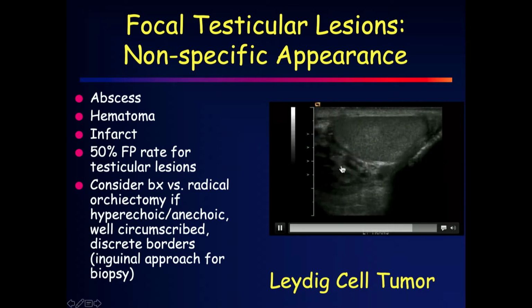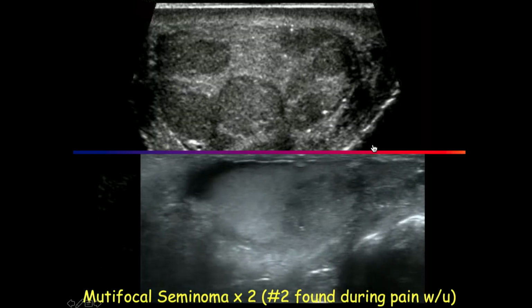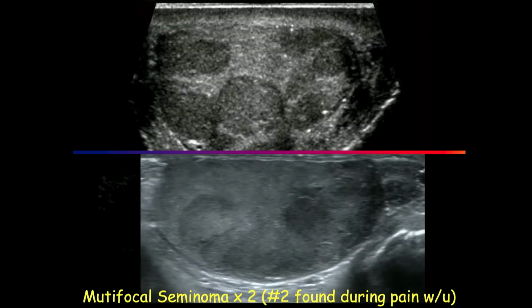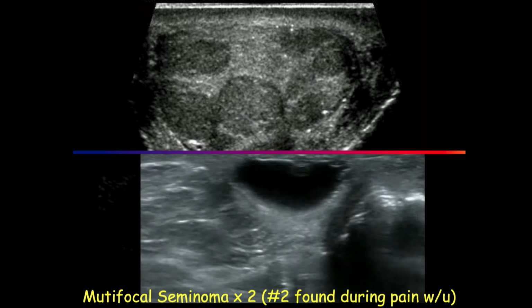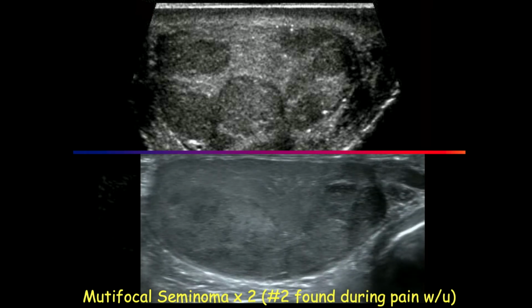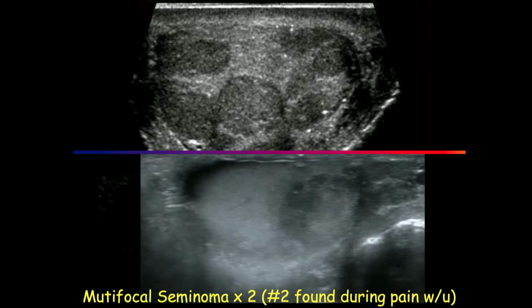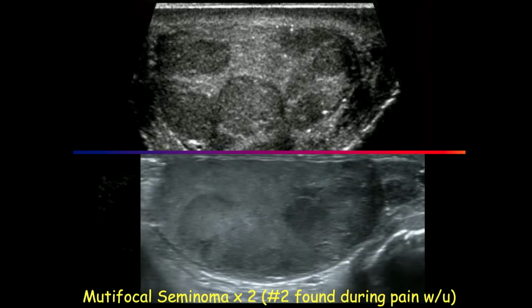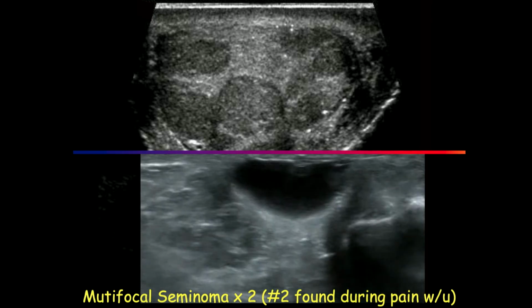And this is just an example of kind of an unusual Leydig cell tumor there. Here are two classic seminomas. We've all seen these a million times in our practice. The bottom image came in for rule out torsion for pain. So remember that a big chunk of testicular tumors hurt. In medical school, we were taught that they were painless masses, but they infarct or they bleed. So when somebody comes in with pain, always worry about an underlying tumor.